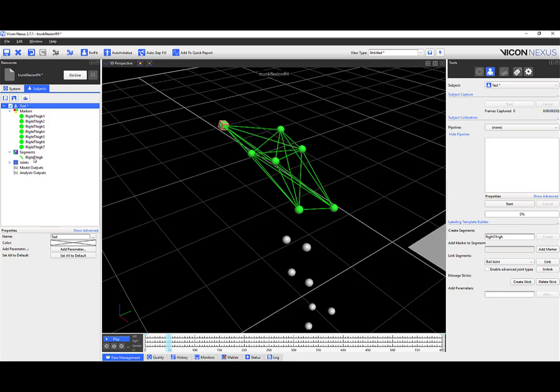I also want to let you know that it's very, very, very important that you're doing all this within one particular frame, okay? So watch this. If I were to scroll my mouse one frame ahead, I lose that. That's grayed out. I don't want that. I'm going to go back to 47, because 47 is where I started.